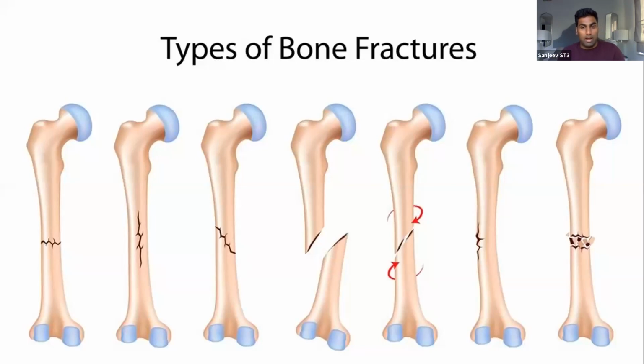So in terms of describing fractures, I'm just going to quickly go through some of them. This is what a transverse fracture looks like, clean, just across, a horizontally orientated fracture. This one's a linear fracture. There's the sort of perpendicular to the transverse fracture. There's oblique, ignore this one. And then there's spiral, so there's kind of like a staircase going up there. Very useful if you do see it, usually happens in long bones. And this is what a comminuted one is, just like I described before, multiple fragments.